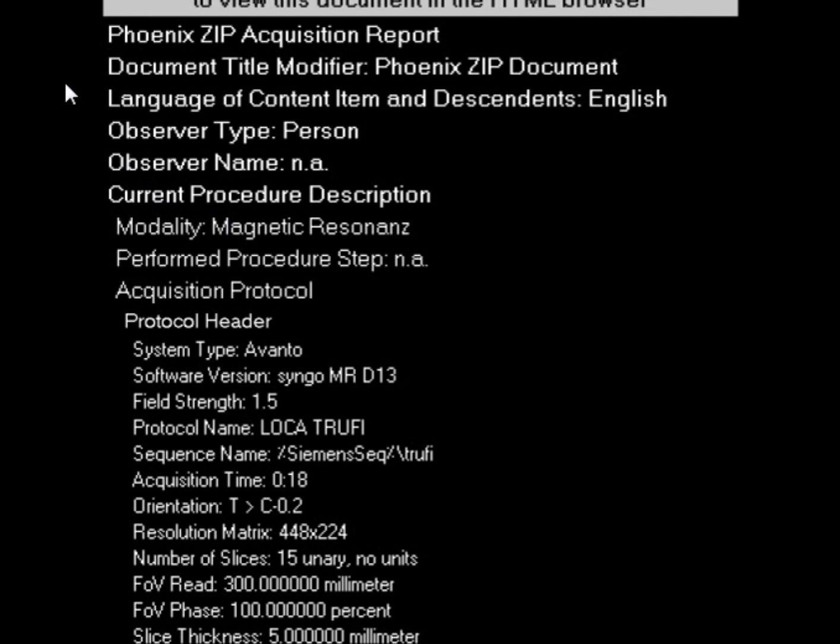What do we have here? This is a 60-year-old female patient presented with bilateral pelvic masses on an ultrasound. Adnexal mass, exactly. So an MRI was ordered for her for further evaluation.